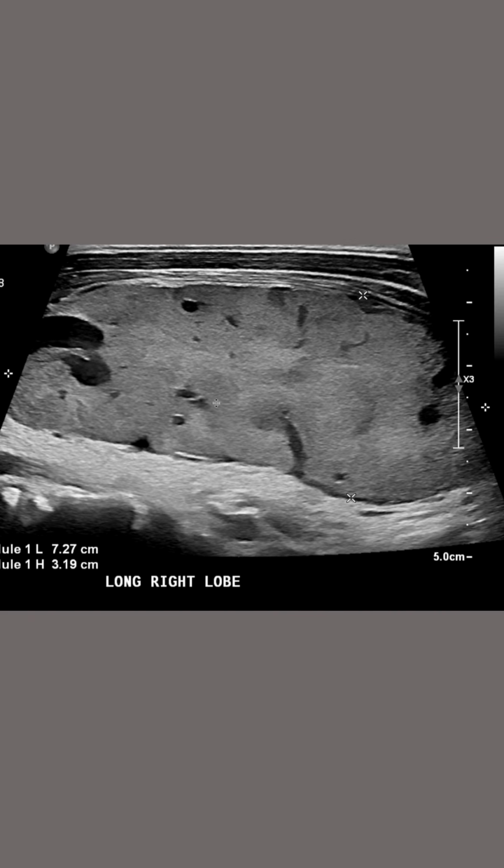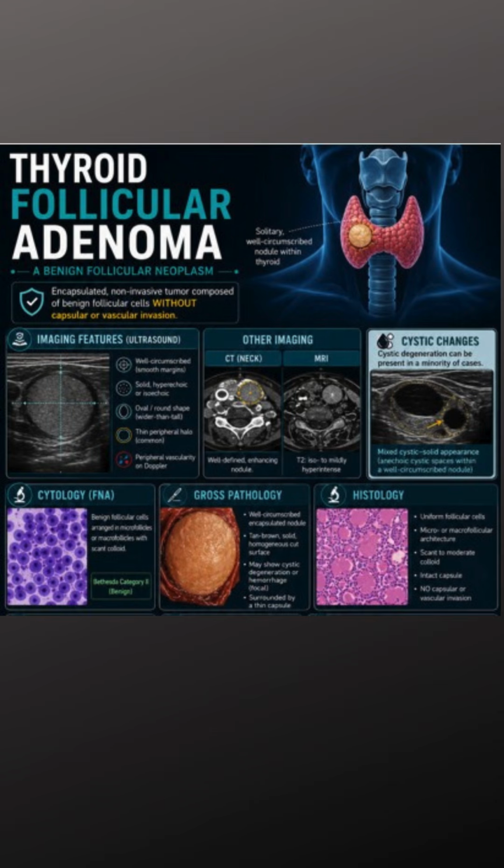It's not microcalcifications, I'm not that worried, but this is someone that had a biopsy before that came back lymphocytic thyroiditis. It's getting a little bit bigger. Worried about neoplasm, so goes for a thyroidectomy. Follicular adenoma. Tissue is the issue.